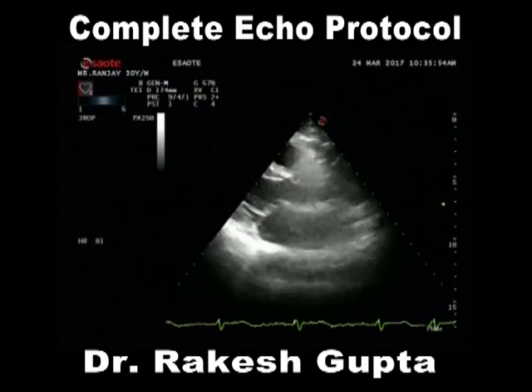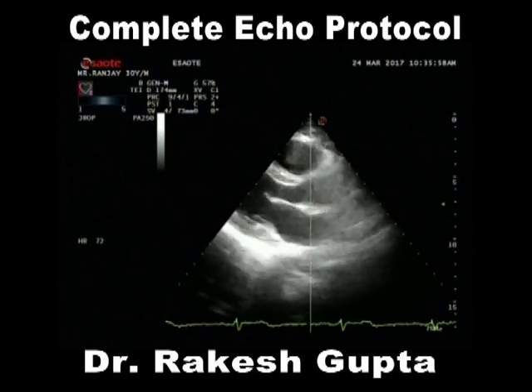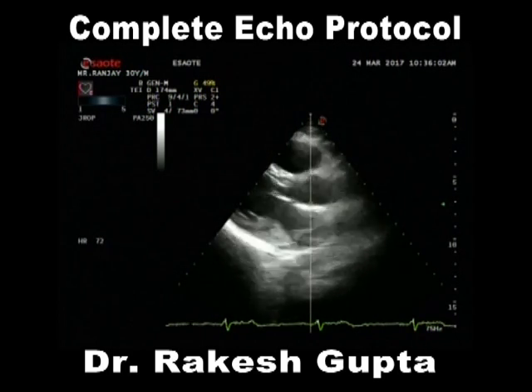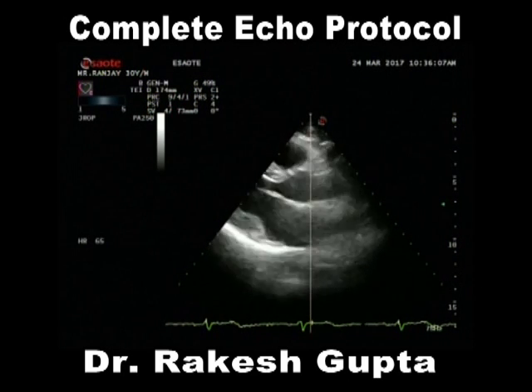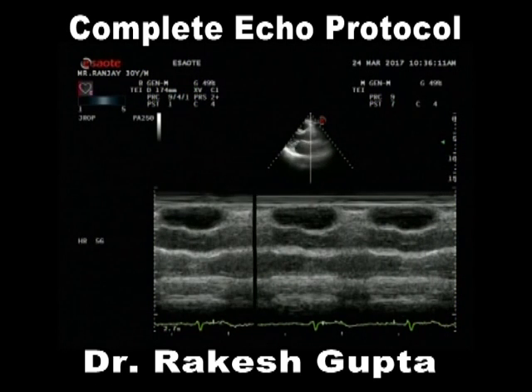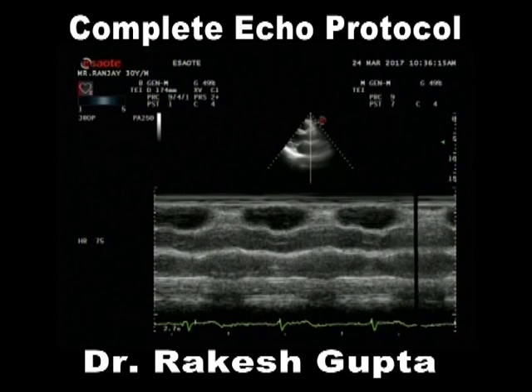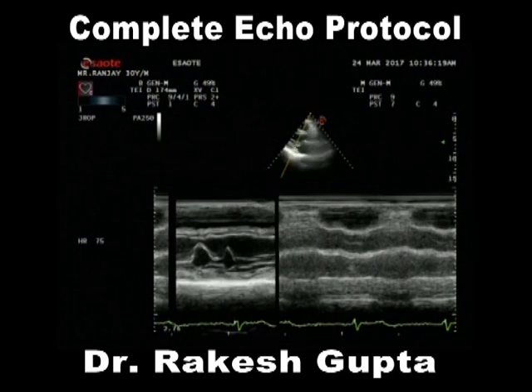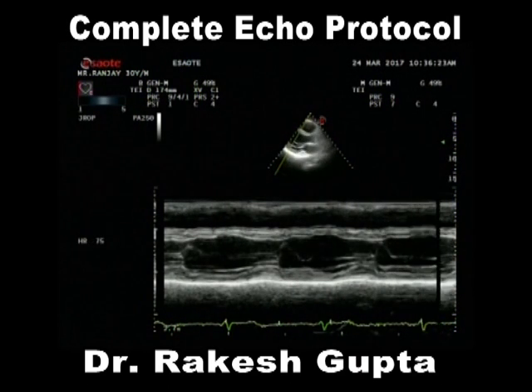This is what we have evolved over a period of time, a little modified from what the American Society of Echocardiography says. We may be overestimating or underestimating by 1 millimeter of a difference. I do not say no, but this way all of us will measure the same thing we have been teaching over a period of time. Drawing a line right into the center, then moving to the tip of the mitral valve leaflets, and finally going just distal to the tip of the mitral valve leaflet.